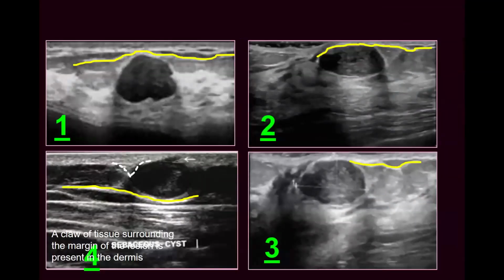Here we have 4 examples. Can you tell me which one? All are hypodermal, all surrounded with fat. But what do you suggest? Which one is dermal or related to the subcutaneous tissue? And which one do you suggest might arise from anterior TDLUs? And why? Do you have any suggestion? Okay, I'll tell you.